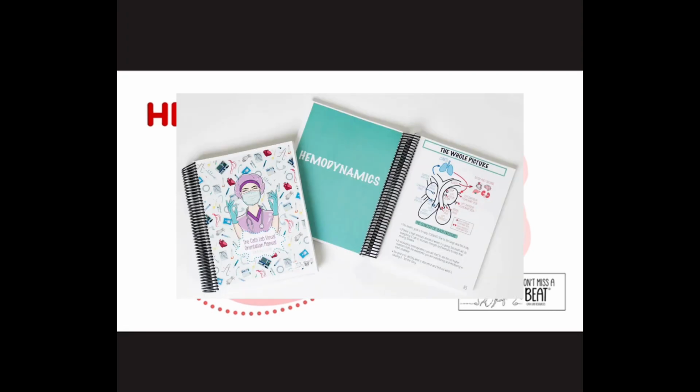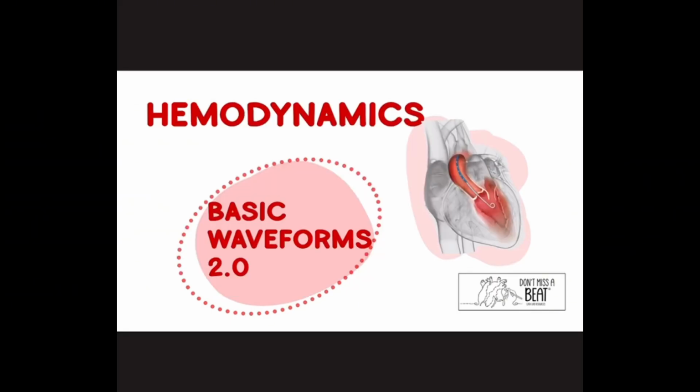Now, if you have the Cath Lab Visual Orientation Manual, the newer edition, this kind of starts on page 117 where we talk about the atrial waveforms, and you'll see it's broken down atrial, ventricular, and arterial, and then it talks about each of the phases and what happens. So this lecture really coincides with that really well, and it goes into a little more detail, but we're going to work on some application on looking at real waveforms. So let's get into it.